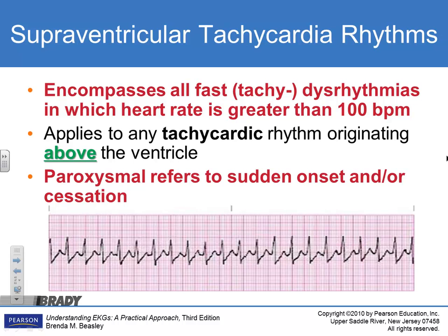How can we tell it's SVT and not VTAC? Narrow complex. If this is narrow here, it's pointing above the ventricles. So do not call this VTAC. I can't tell you the number of students that have called this VTAC. I will hunt you down, and we're going to get out our crayons and draw little complexes, okay? So this is above the ventricles.